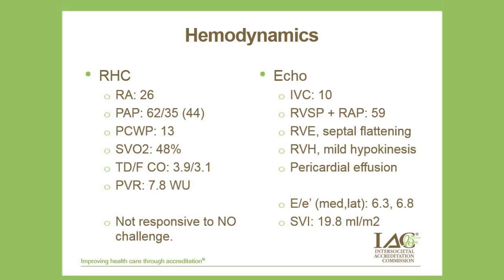In patients with pericardial effusion and concomitant pulmonary hypertension, that is a very worrisome sign and indicates severe pulmonary hypertension. Of course, she has New York Heart Class 4 symptoms. That also points toward severe pulmonary hypertension.